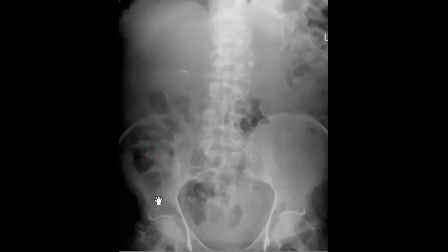Nice. So maybe something here in the mid abdomen. So do you agree that maybe it is not just okay, yes, you mean this one. Okay, nice. So I think that you agree with me that yes, there is calcification in the mid abdomen. Perfect. And there are surgical clips in the right upper abdomen.